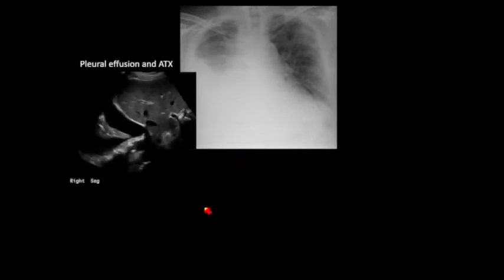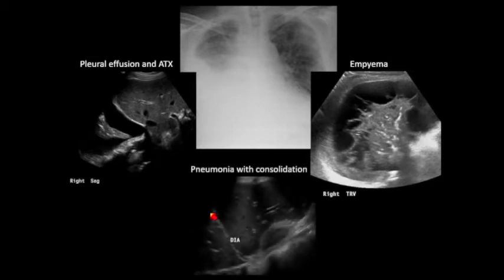And lastly, remember that, if you read surgery texts about right upper quadrant pain, things that go on in the lower portion of the chest can often give people right upper quadrant pain and bring them in, and obviously vice versa. So sometimes we can be helpful there. If you have a person who has a chest radiograph and there's all this white here in the lower half of the chest, you really don't know without other imaging or other views how much of this is fluid, how much of this is lung, etc. So here are 3 different examples of what that could be.